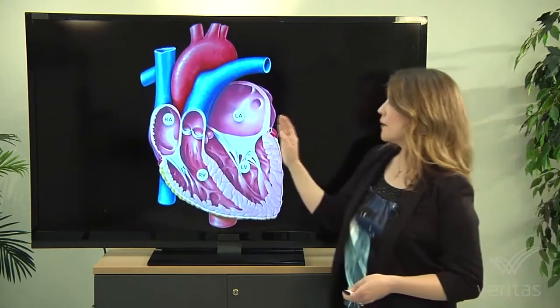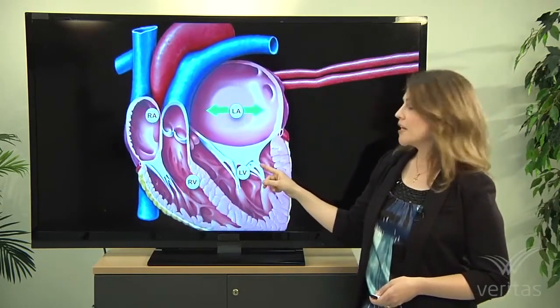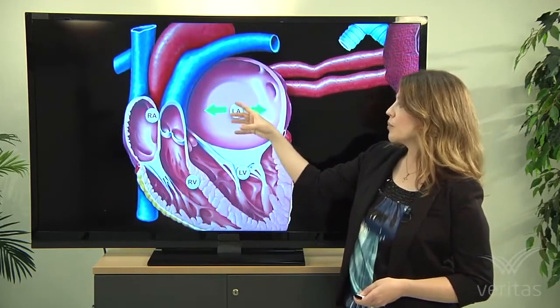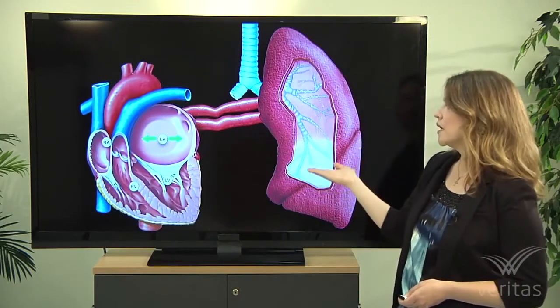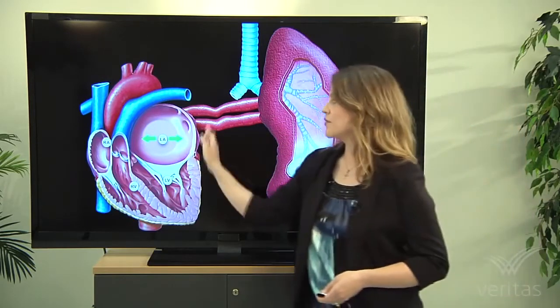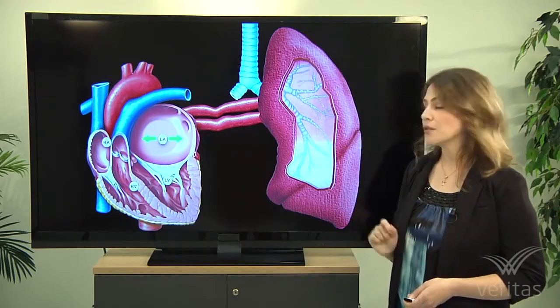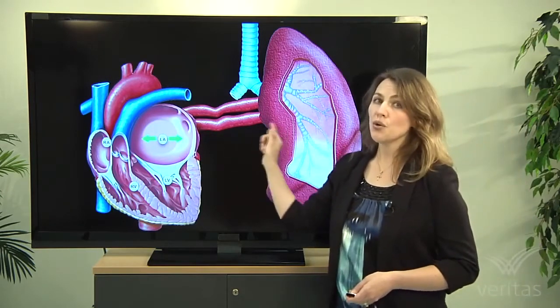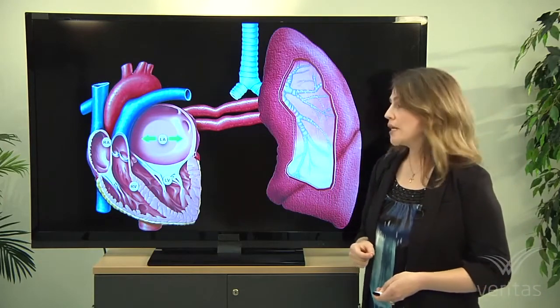So in this image here, here's the left atrium. If you had a dog with mitral regurgitation that's filling up the left atrium, making the pressure increase, the veins increase as well, and then fluid leaks out into the lungs. So the part to remember is when you have left atrial enlargement and you have an interstitial pattern, one of the things that I'm trying to look for is the connection. Do you have pulmonary venous enlargement? So how do you assess that on radiographs?